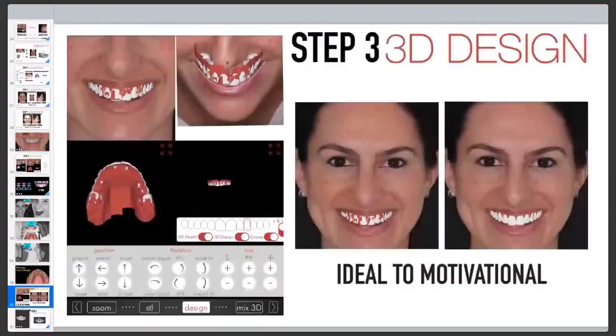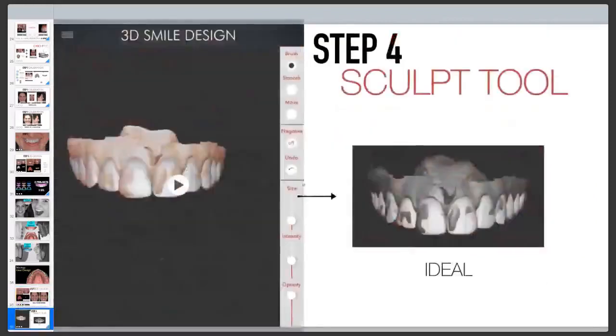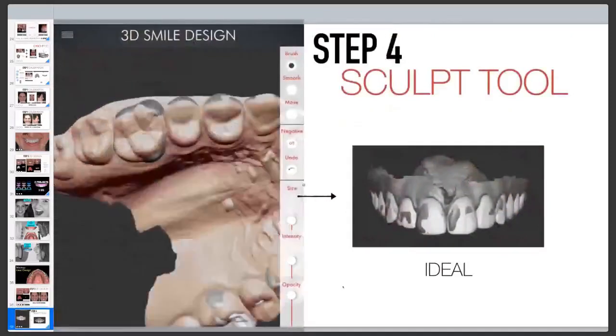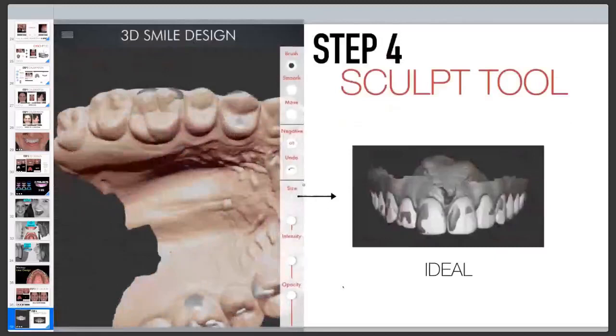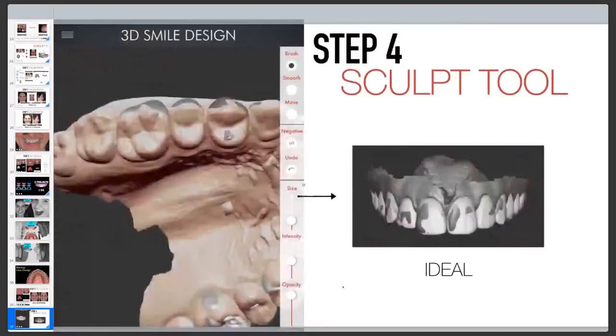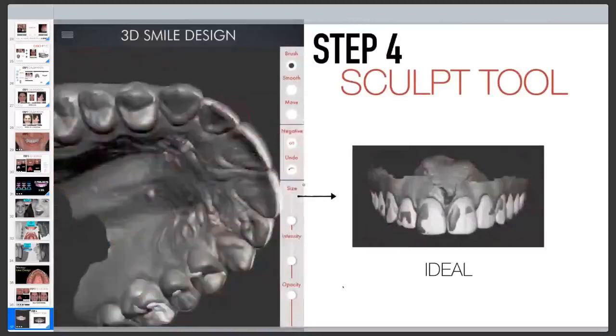So here you can easily see, this was a planning. We started with the ideal for the patient, and then we just adapted to a motivational. The SCULPT tool also allows us to do that. So here's just an example. See, we are erasing the occlusal areas, so you can adjust the design. So we remove the occlusal interferences for the model.